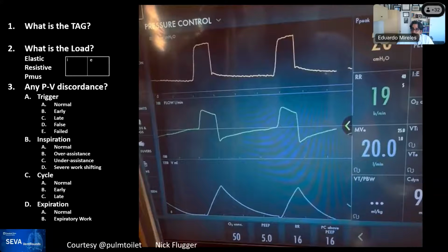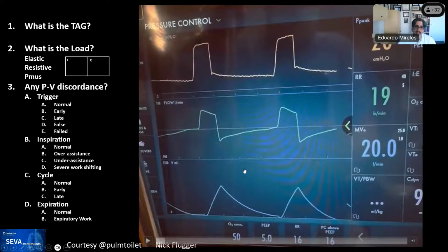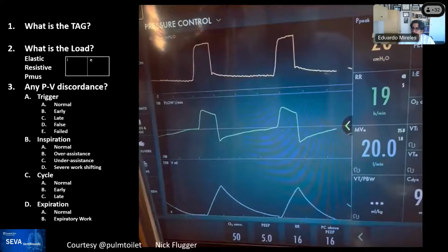That's wonderful. Those are the ones that I really enjoy the most, is when you are walking through the room, and that's how they got these sequences. You're walking through and you turn around and see something happening, and you take a picture. And so what you're seeing is a breath sequence that is consistent. And somebody has called it. This looks like Cheyne Stokes.